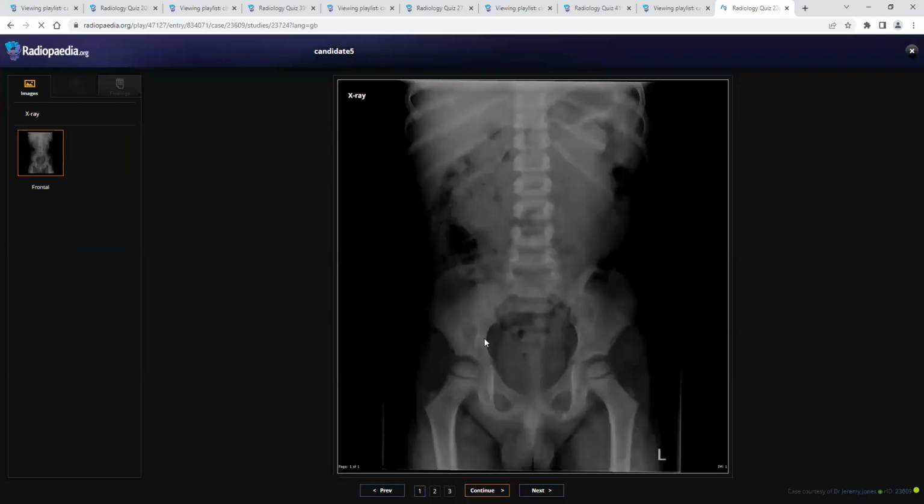And the previous images, yeah, this is the lucent lesion. Can you see? I was thinking of a lucent lesion in the femur. But you see the preperitoneal fat plane, it comes like this and ends here. Anything lateral to this line is a bony abnormality, not the bowel shadow. So compare the same line on the right side also. This is outside the preperitoneal fat plane, so you should suspect a bony lesion.